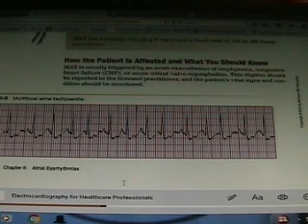Okay. So if that's abnormal, I know the P wave is messed up. I'm looking right at the craziest P wave I've ever seen. Looks nothing like NSR. So now I know it's what? It's got to be multifocal atrial tachycardia. Because the P wave's messed up and it's fast.